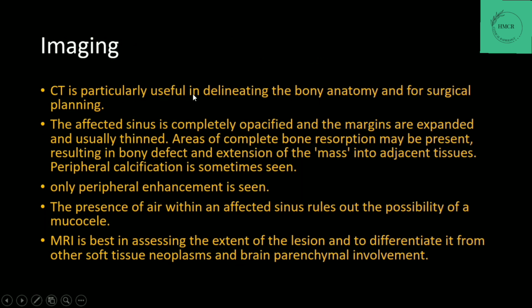CT is particularly useful in delineating the bony anatomy and for surgical planning. The affected sinus is completely opacified and the margins are expanded and usually thinned. Areas of complete bone resorption may be present, resulting in bony defect and extension of the mass into the adjacent tissues. Peripheral calcification is sometimes seen. Only peripheral enhancement is seen within them. The presence of air within an affected sinus rules out the possibility of mucocele.